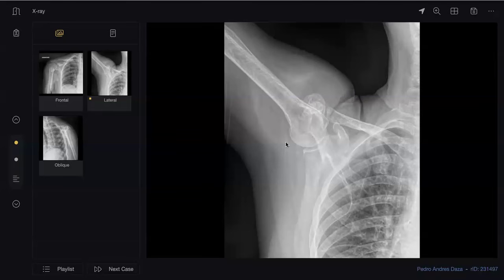What is this? Soft tissue mass. Yes, this is the osteochondroma, and this is the soft tissue intramuscular myxoma. So this could be a myxoma? Mazabraud syndrome? Is Mazabraud seen in osteochondroma? No, sorry.